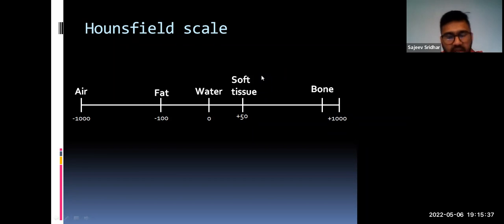The key thing to remember is that clotted blood would be in the 70s, 80s, 90s. If you see anything in that range, and it is quite obvious, particularly if we're dealing with acute intracranial bleeding, strokes, or vascular issues, you should be able to spot that quite quickly.